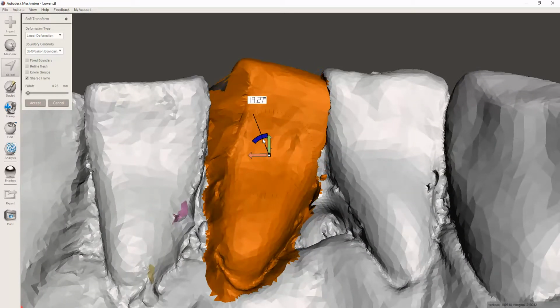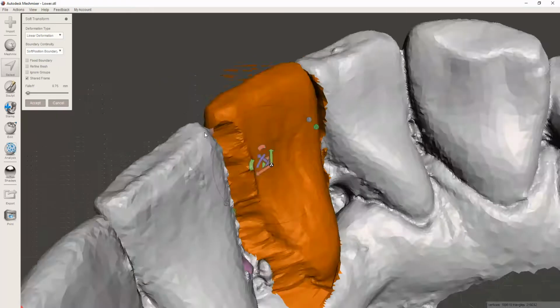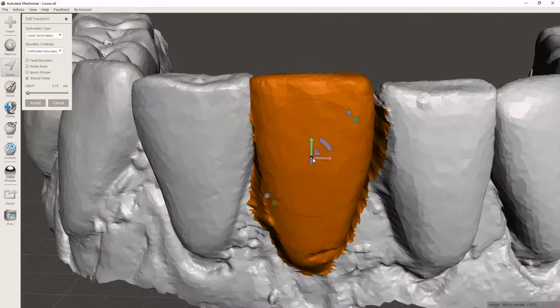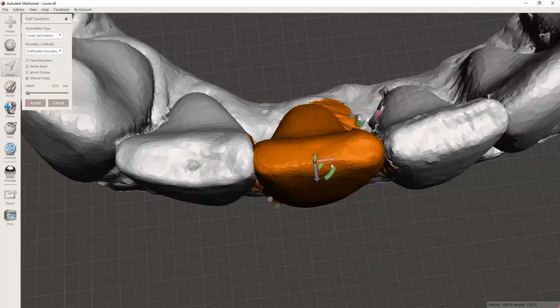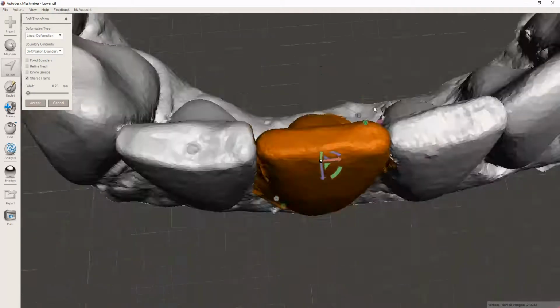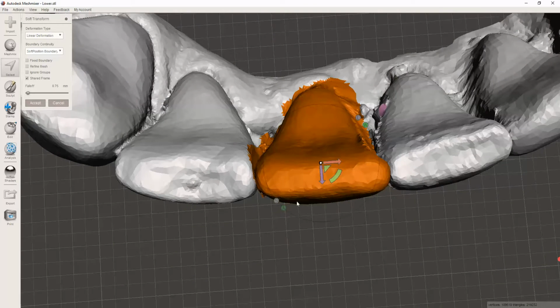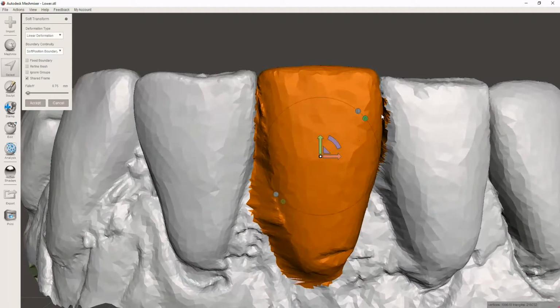So that's where it was essentially in the lingual. Now, like I said, as you do rotate the tooth, the cingulum is going to sweep away, but we just kind of have to know what's realistic. And also, as I swung that over, the incisal ledge was no longer centered. So now I'm fairly centered. I know that my rotation mesial distal is pretty good. My height is fairly decent.